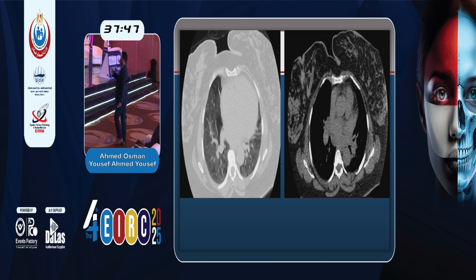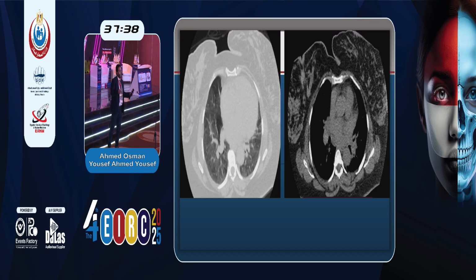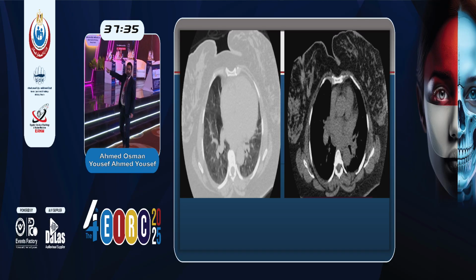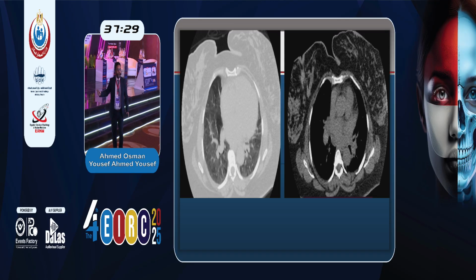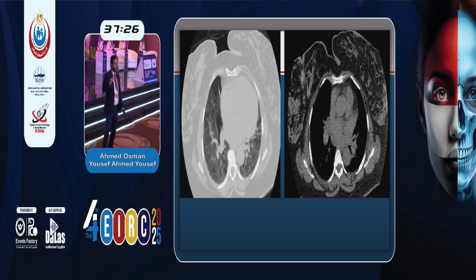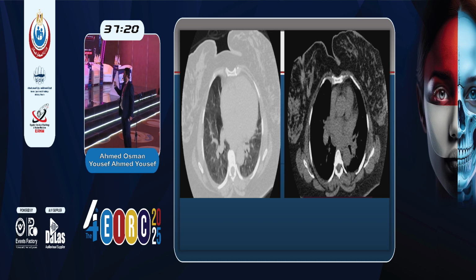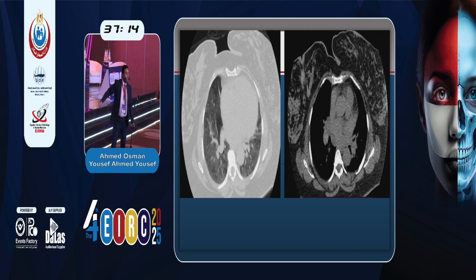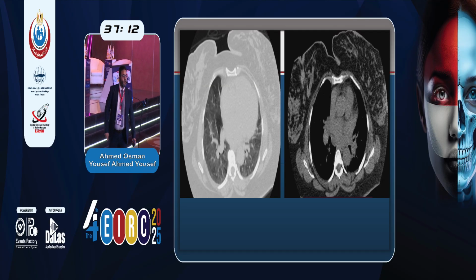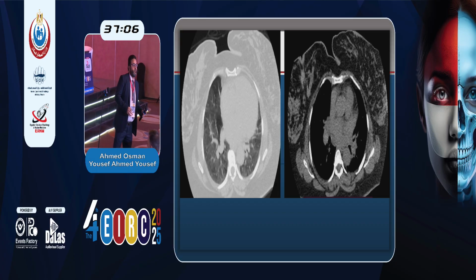And we have what's called pulmonary mosaic attenuation of the lung. We have areas of ground glassing, whitish areas, alternating with blackish or normal lung or areas of air trapping, and this is what's called pulmonary mosaic attenuation. So we have three sure findings: cardiomegaly, pulmonary mosaic attenuation, and unfortunately a right breast spiculated suspicious mass lesion.